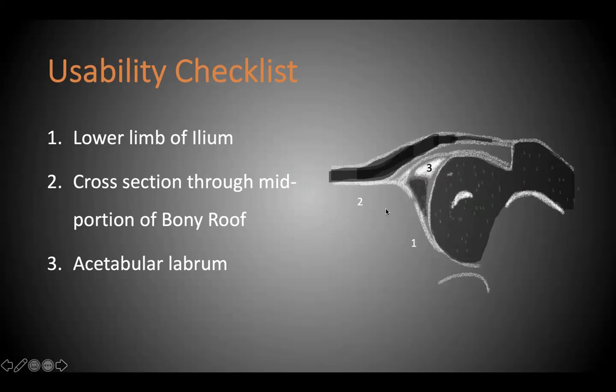So sorry, coming back to Nandini, you wanted to trace what? So the bony and cartilaginous roof lines. Actually, I think I was having a similar problem as Sanika, which is why I was getting a little confused when you showed us how the tracing was done. Okay.